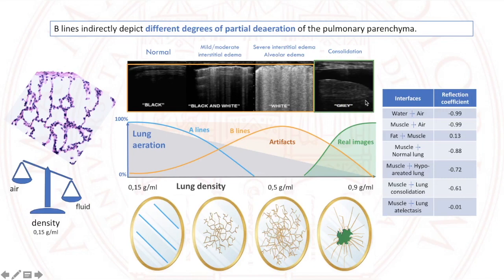So that means that the lung parenchyma, which has lost about all its air content, could look like a normal tissue, and that is a real image. Now we could measure this tissue and we would have consistent results. So as we reach a peak of interstitial syndrome, we could reach the stage where consolidation appears.